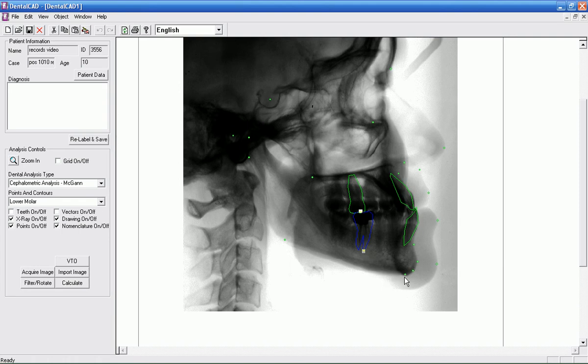Next time I click F2, I'm going to get the lingual symphysis here. And it starts at menton. Menton 1, posterior symphysis, and the superior symphysis. Okay. Now, in between the square dots, or points, you're going to see these little tiny squares, and you'll move them and let them distort the line to fit your curve.